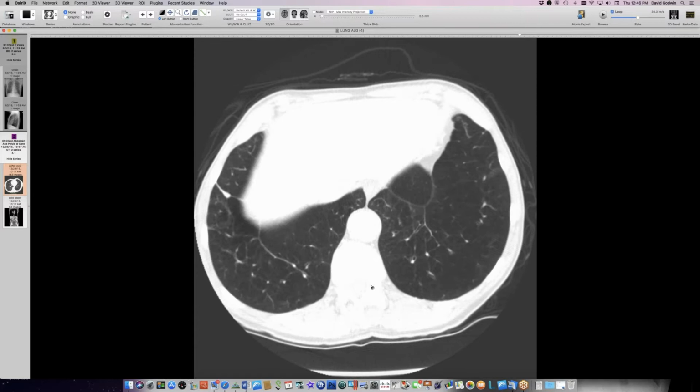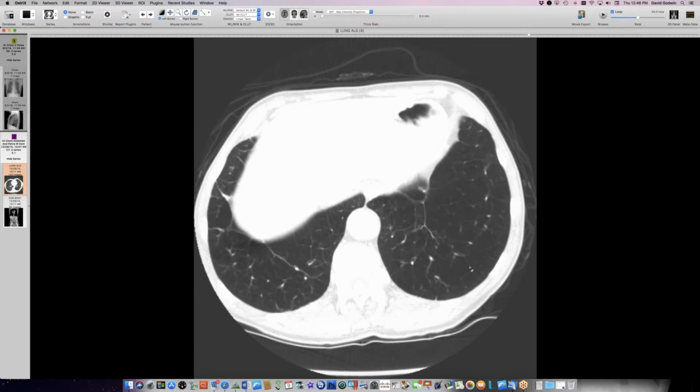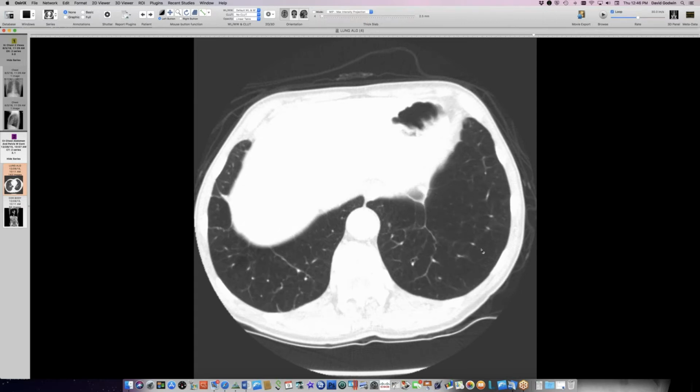And the interesting thing about alpha-1 antitrypsin deficiency and Ritalin as well is that when they get this really confluent, fairly uniform emphysema, it becomes harder to recognize it as emphysema because you don't have the transitions between the holes in the lung and more normal parenchyma. When it's really wall to wall, where it goes all the way out to the edge of the lobules, you just have the sea of blackness and spread out vessels. So it's really the vascular spreading here that's the clue you're left with, that there's emphysema here.